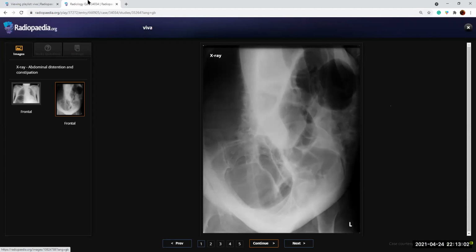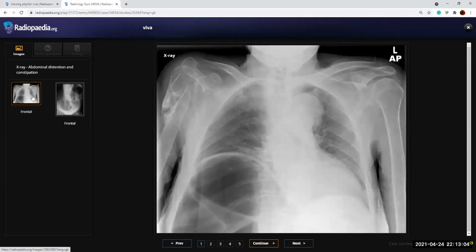So you mentioned a fracture up there. You think it's significant right now? If I'm thinking about a hernia, no. But if I'm thinking about a malignancy causing this kind of obstruction, then I would retract my statement of a hernia causing this obstruction. If I'm thinking of a malignant stricture causing this kind of bowel dilatation, it could be a pathological fracture due to metastasis from a colorectal CA.